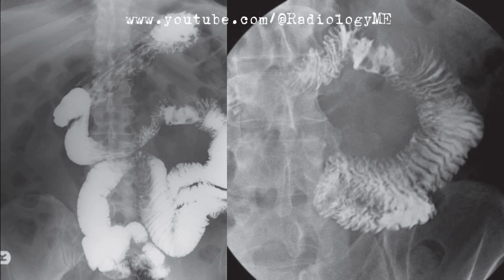However, I'm also thinking about other possibilities like adenocarcinoma, carcinoid tumor, or even Crohn's disease, though the latter is less likely due to the solitary nature of the lesion. Now, what else could this be? Well, if the patient has a history of inflammatory bowel disease, we could consider Crohn's disease. But again, the lack of multiple lesions makes this less likely. If there's a history of celiac disease, lymphoma becomes even more probable.